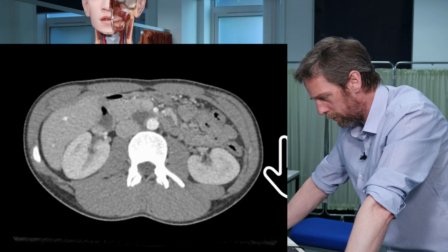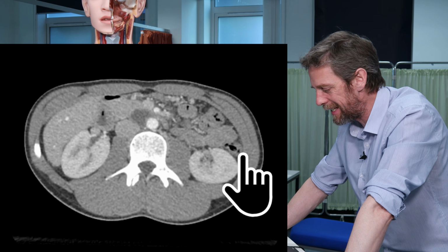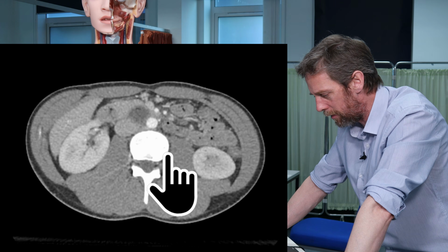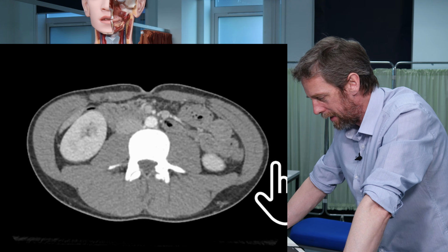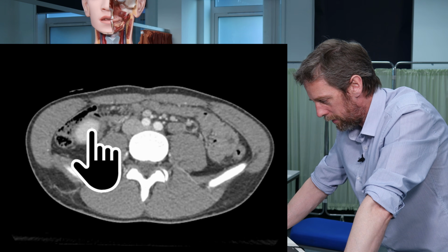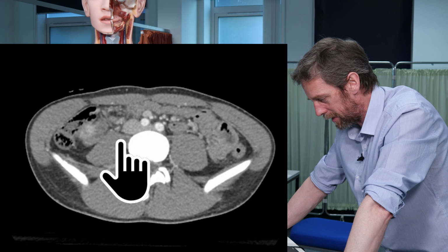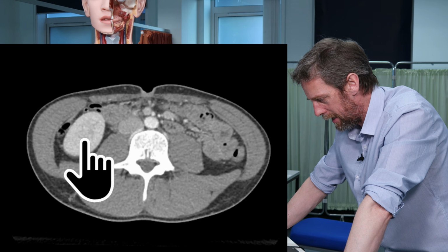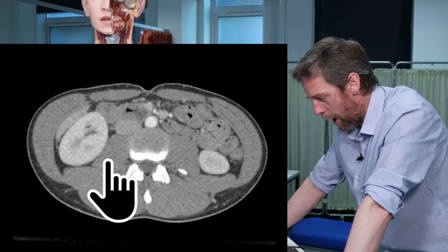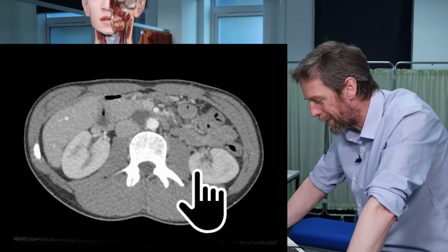And as I scroll down, we're seeing it's very, very kidney-y, right? Do you agree with me that that's very kidney-y, kidney-shaped? It's very posterior. It's up against these muscles. It's got kidney written all over it, right? And so the left one has disappeared now as I scroll down, and there's the right one about to disappear. And we're seeing some spaces here of the large bowel. Kidney, kidney, posterior, up against these big muscles, right? Posterior. Why am I harping on about this?